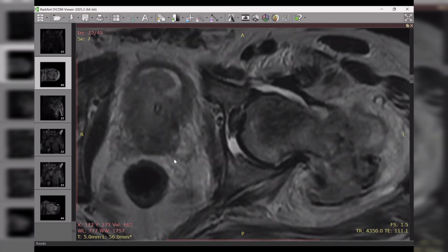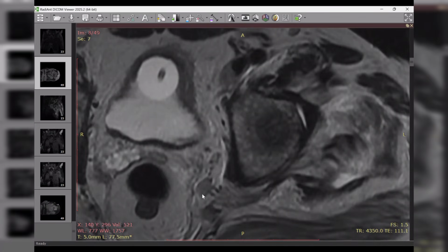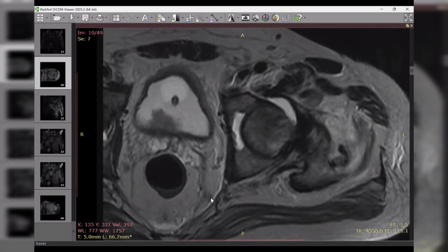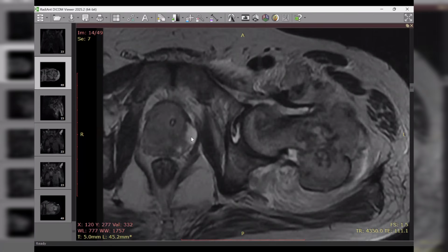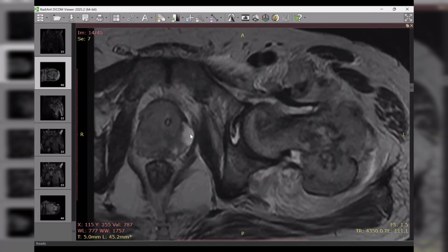You told me there is a lymph node. Pelvic, yes, and the prostate invades the bladder. And this is the remaining segment of the peripheral zone that contains the normal bright T2 signal, and the remaining peripheral zone is infiltrated.